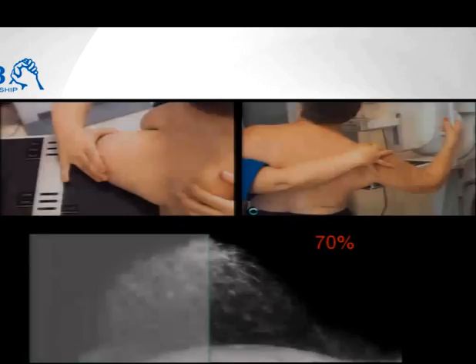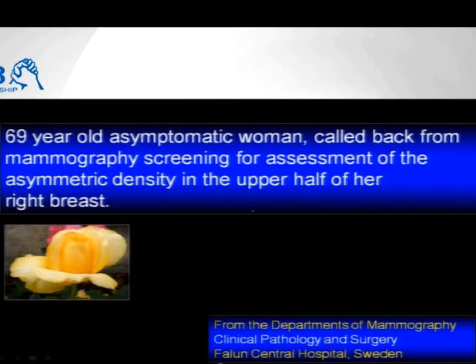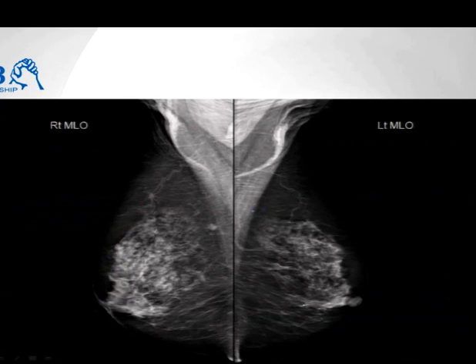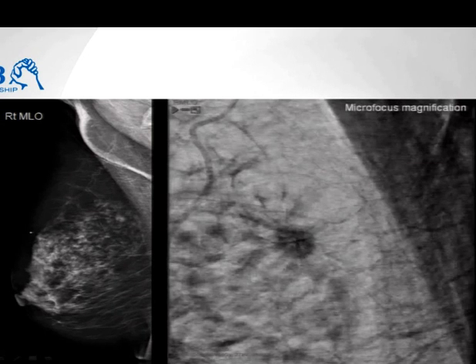We're going to have time for just one case. This is an ideal positioning with normal mammogram. And dear colleagues, here is a 69-year-old lady whose cancer or asymmetric density you immediately spot because that's on the Milky Way. You don't know whether it's a cancer. Don't make diagnosis on screening. You call her back, and that's a stellate lesion. It's a solitary stellate lesion.